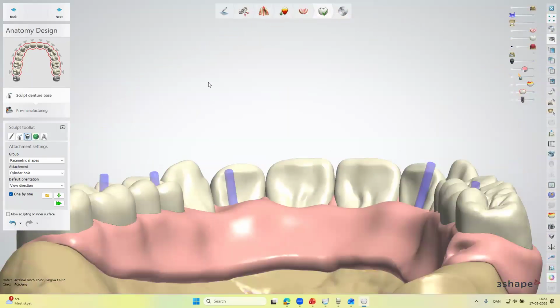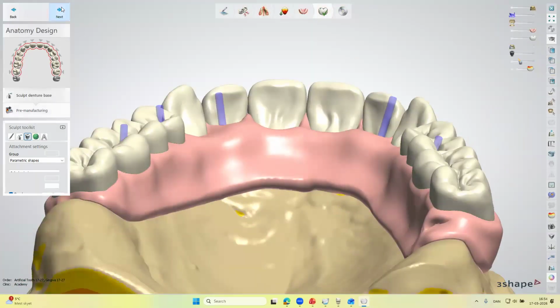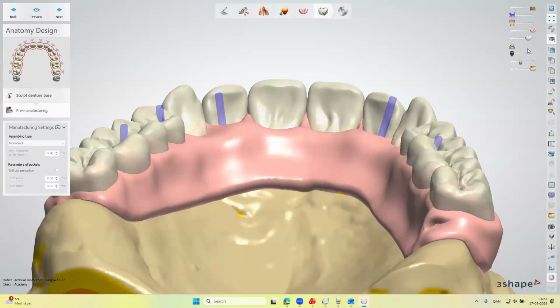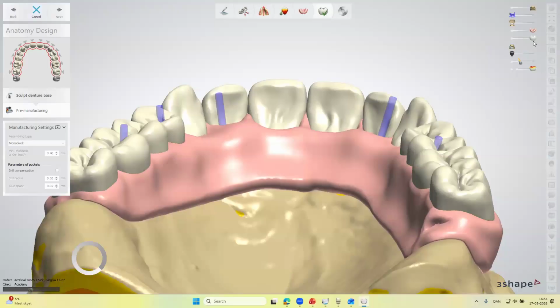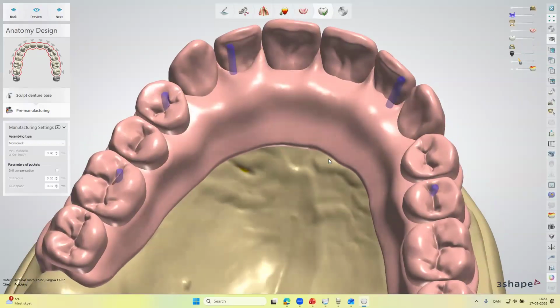It should be going through. Okay, and then it's a matter of saving element. Right now they are still separated, but once the software will calculate them both, you will see that they are placed together as one object.